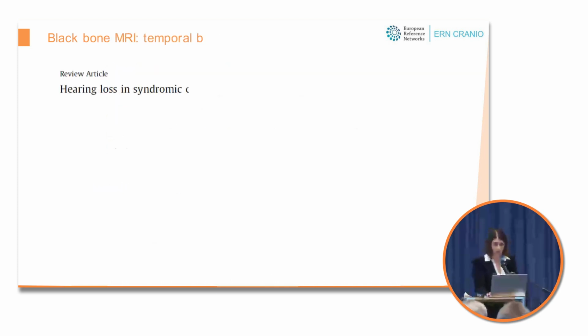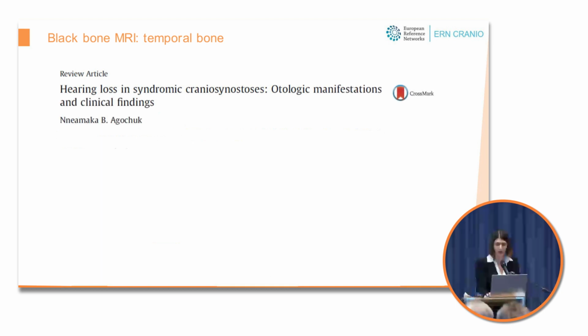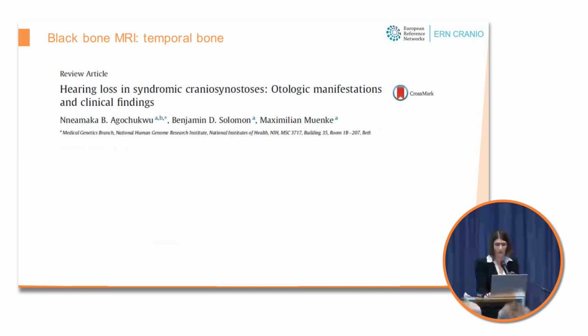When dealing with craniosynostosis patients, temporal bone assessment might play a role in the management of the patient. Temporal bone malformations have been described in craniosynostosis patients in association with hearing loss, as previously mentioned by Dr. Brotto. Malformations reported in literature include external auditory canal atresia, ossicular chain malformations, cochlear abnormalities, dysplasia of the structures of the posterior labyrinth.